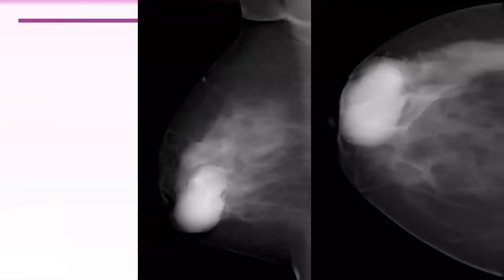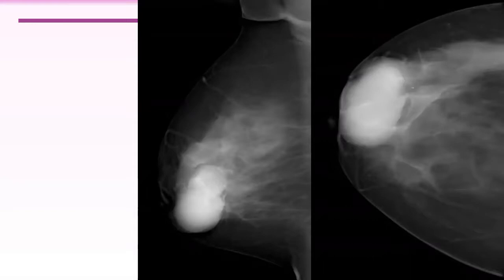This is 3 years back. The patient was brought at that moment when we diagnosed; that image was not available. We reported it as BI-RADS 5, highly suggestive of malignancy by features, by characters. But it was just a papilloma or multiple papillomas.